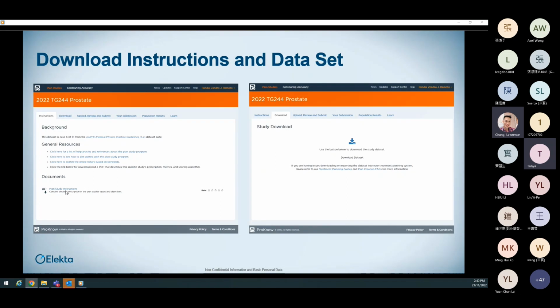You'll also have some documentation here as well. If you click on that particular link, you'll be presented with a set of instructions about how to get a really good score for these challenges. It'll actually detail the scoring criteria.